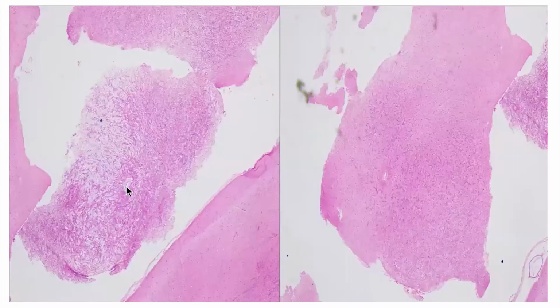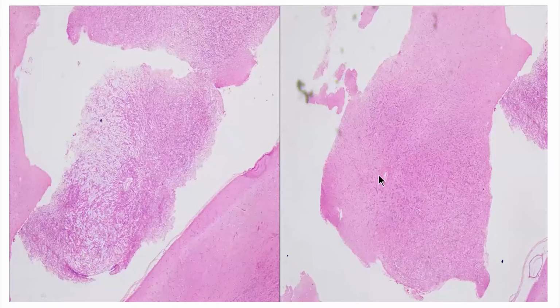Here was the clicking point, where I could see the radial arrangement of the tumor cells around these vessels. So, radial arrangement of spindle-shaped tumor cells, showing multi-layering and present in the cortex, presenting with intractable epilepsy. Here also we can see this vessel and the tumor cells present around these vessels.